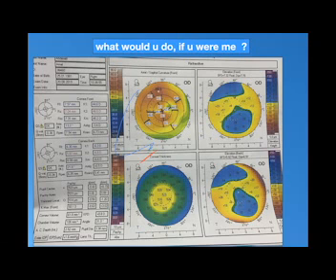I'm waiting for your diagnosis and decision. This patient came to me seeking refractive surgery.